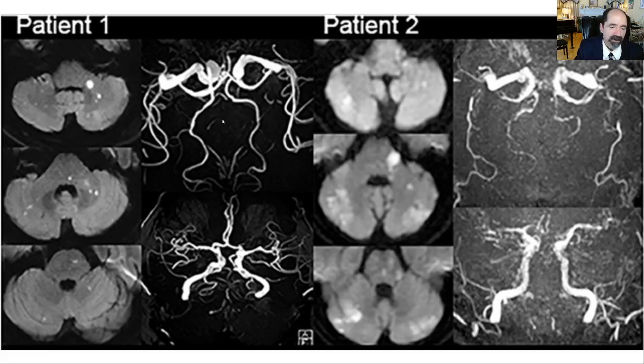The basilar artery is so hypoplastic we can't even see it. Perhaps it's thrombosed, perhaps it's severely narrowed, severe stenosis. And these are probably time of flight technique on the MRAs, such that they're not very sensitive for picking up slow flow and minimal flow in a small basilar artery. One might see it better if we did a CT angiogram.